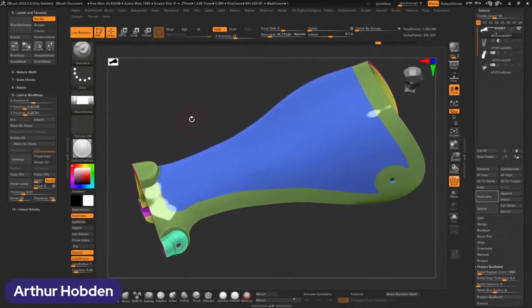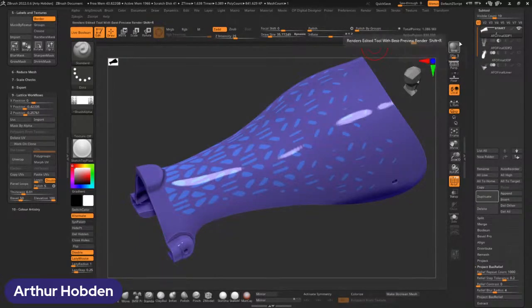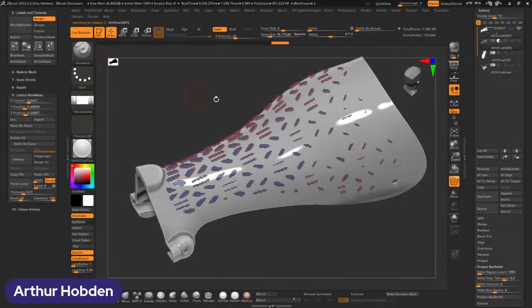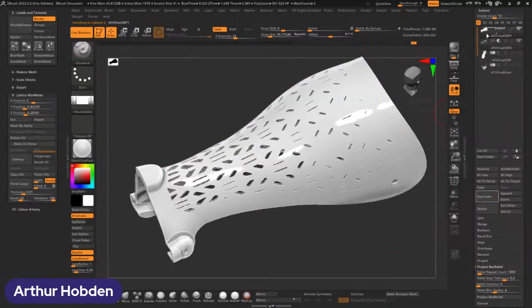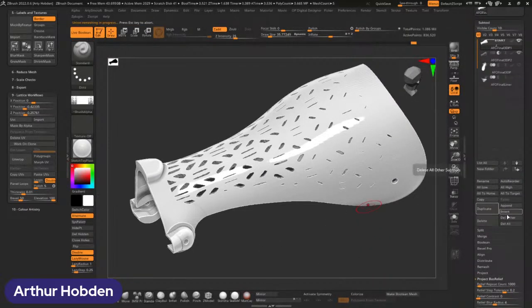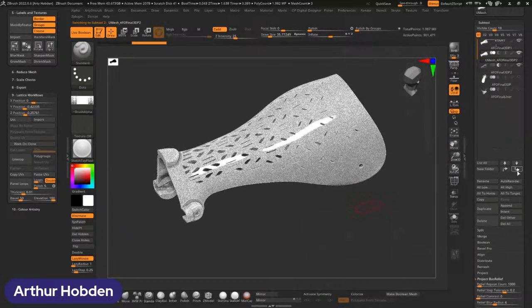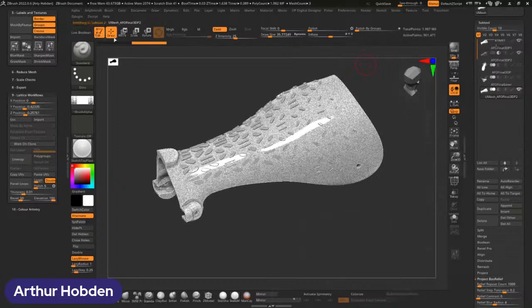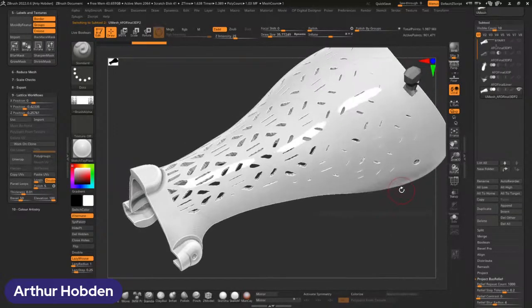So now that we've looked at those textures and being able to punch through things, can I do that one more time live? Let's create a Boolean mesh from this so we can have a copy of this. So we can insert this back into our part. There we go. There's the final version. We can turn off live Boolean and remove everything else. Here is our new mesh that was made from that.